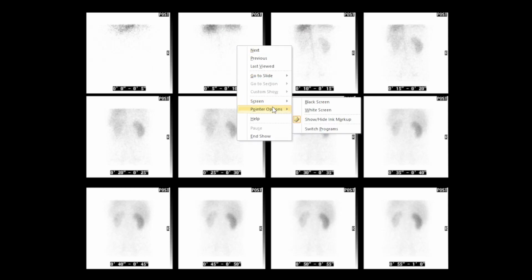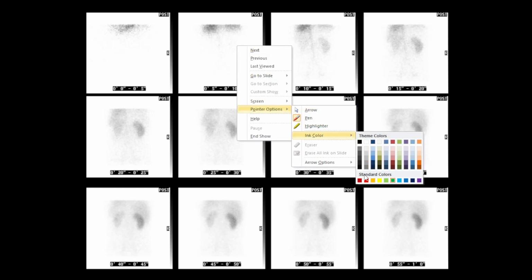So let's have a look. So that's a capacious system. Now let's look at a patient who's actually genuinely physiologically obstructed. So this is our old friend, the initial images. If you remember, this is the first minute, which we looked at before. And here we can see the tracer coming down. I'm just going to change back to red, actually. Seems a good baseline color.